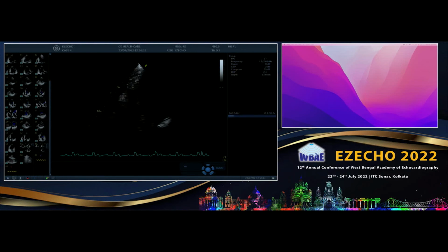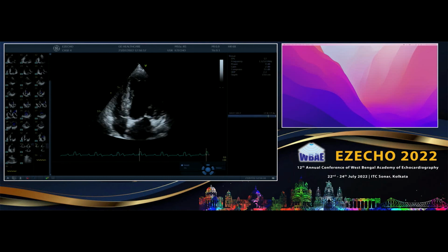Filling pressure. First, a very simple one we use, though in the literature there are a lot of these, I don't remember them, but I always remember 2 things. One is that you just take a long mitral flow. If there is no variability in the E waves or very minimal variability, which is a very classic sign of raised filling pressures. Because if there is RR variability and you don't have any variability in the E wave, your LV filling pressures or LA filling pressures are very high.